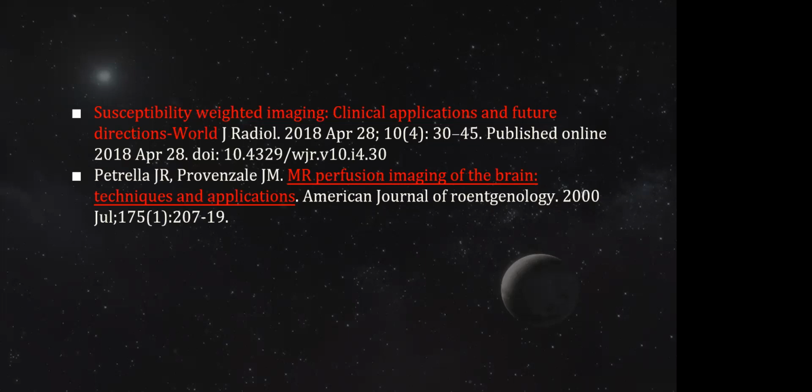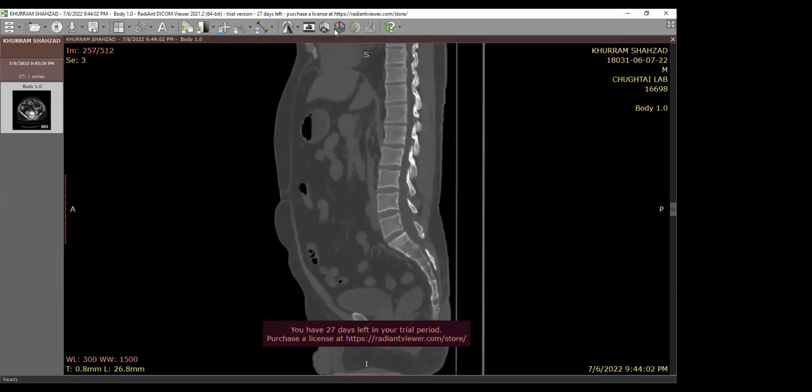Okay, and someone has asked why the CT films are not enough. I will share my screen again with you. Okay, can you see the images here? I have opened up a study of a patient. I should actually hide the patient data.